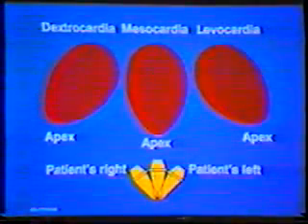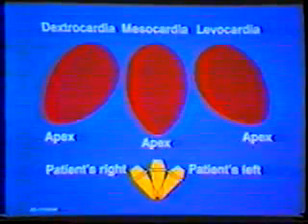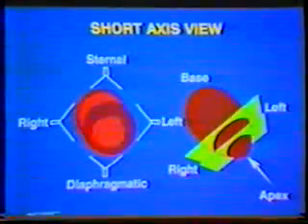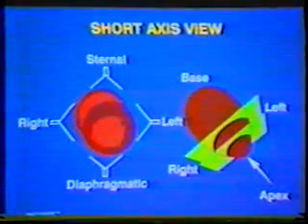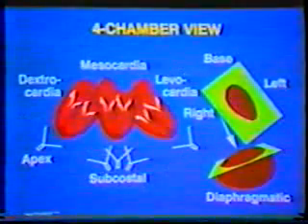It is important to remember that the image orientation of each view is the same regardless of cardiac situs. This point is schematically shown here. Study this schematic so that you can become familiar with image orientation.